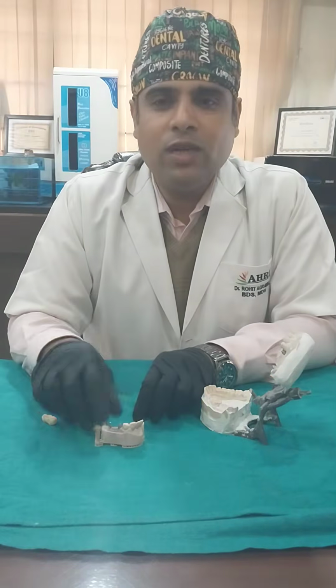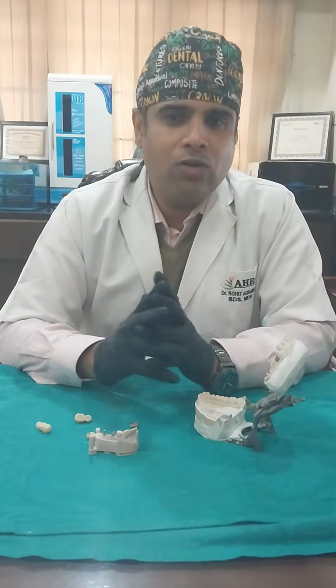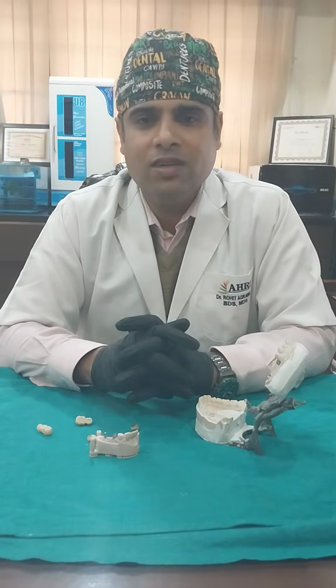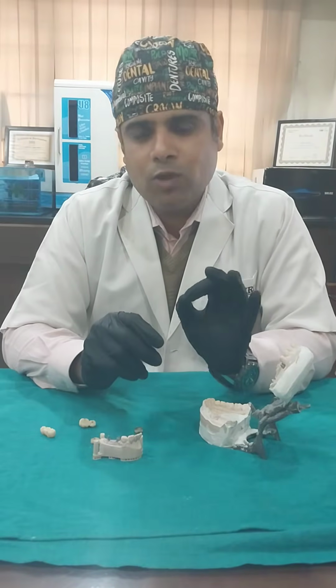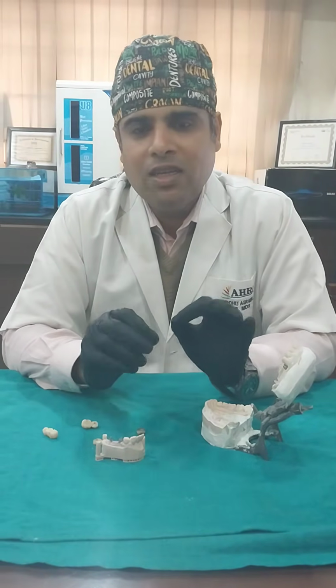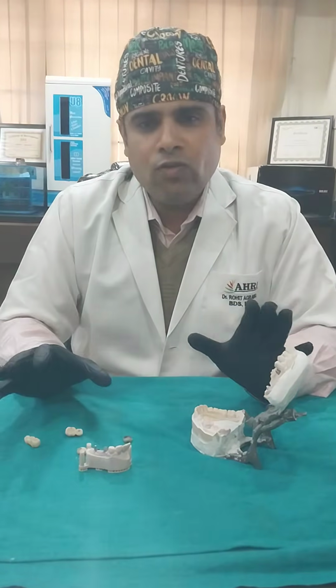Hello. Today we are discussing a very important topic in the field of implantology. As we all know, implantology is prosthetically driven. So today I will be talking about a very important aspect of the prosthetic part of implantology, that is good lab versus bad lab. I will show you a few cases.